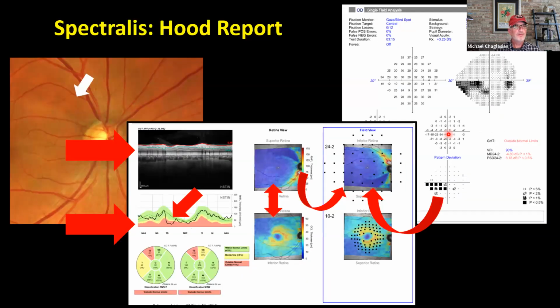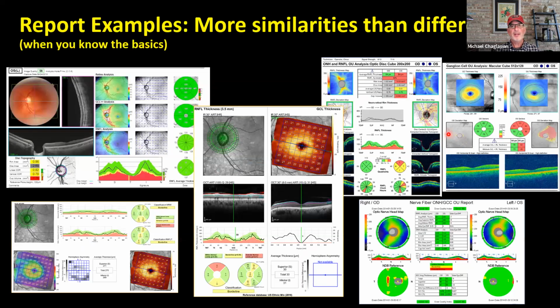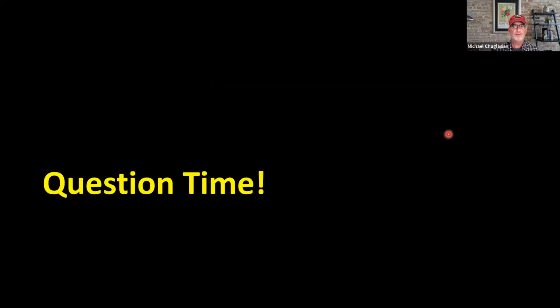And is this another example, or the same example, just showing you a slightly different way? So again, lots of reports, more similarities than differences overall, but it's difficult for us to talk to one another when we have these different instruments and different displays.